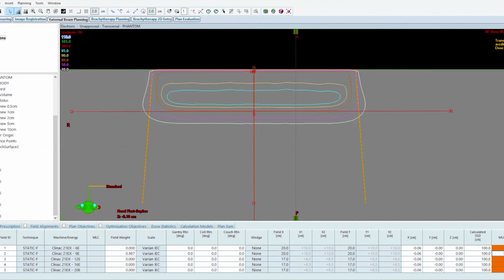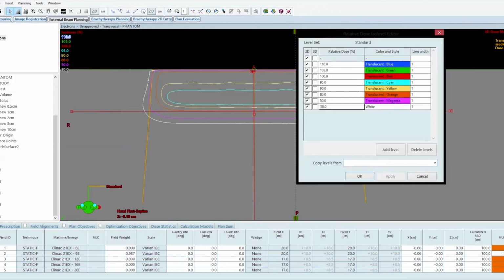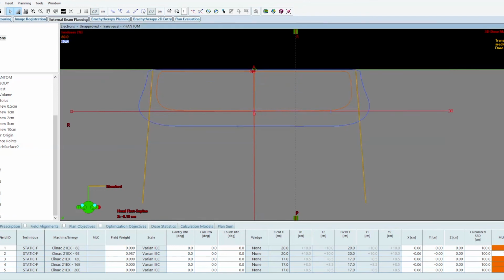As the electron beam travels through the patient, it loses energy. As it's absorbed in the body, at 2 MeV per centimeter in water, and as it loses energy, we have more side scatter, and the beam spreads out. You can see this in the isodose lines too. If I put on 20%, and let me turn off everything else, you can see my 20 and 80% isodose lines give my penumbra thickness.